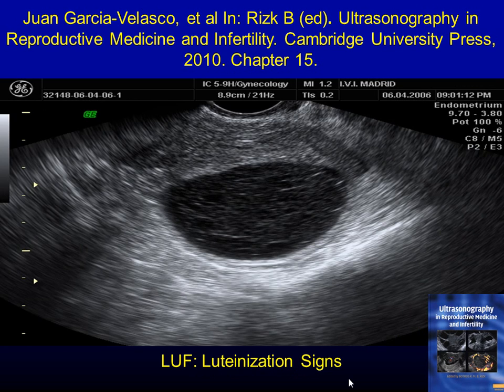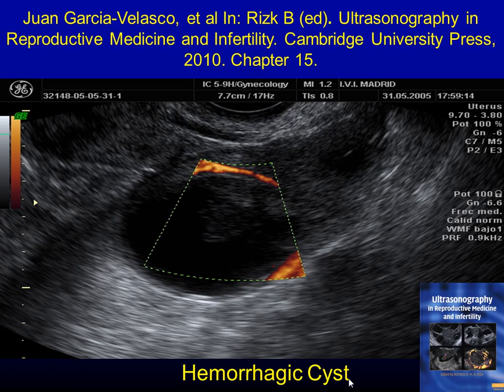Again, this is what in the past, in the 80s and so on, used to be described as a luteinized unruptured follicle. Luteinized unruptured means that there was a follicle, it didn't pop the egg, but the progesterone went up. So you check her progesterone, it's normal. You see on ultrasound, the area didn't disappear. They said 5% of women simply have a problem in releasing the egg, in popping the egg out. So it's called LUF or Luff syndrome, really of very small significance.